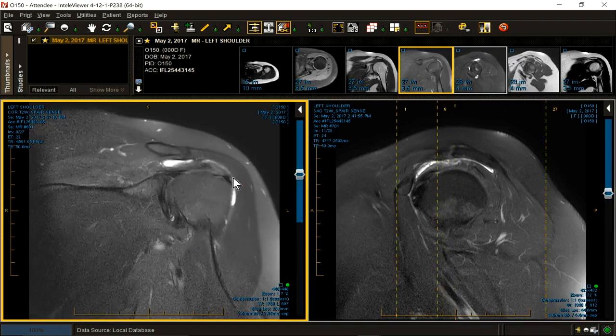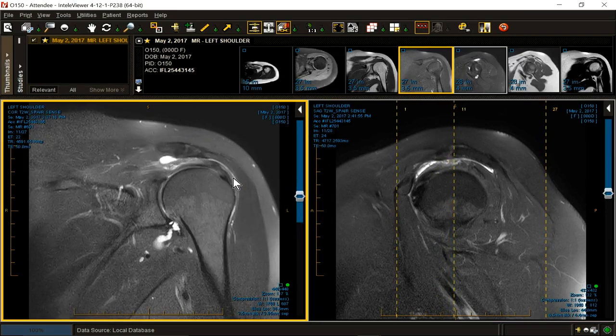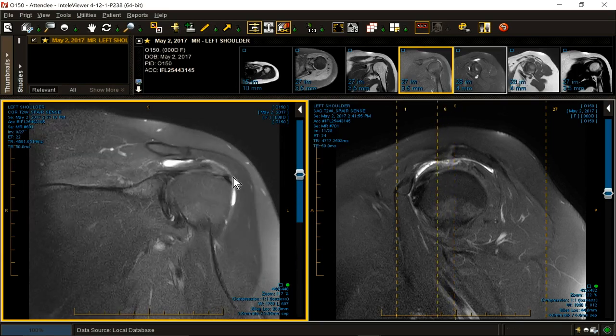We've got some high signal intensity areas, so that draws us right to the area of interest. We were alarmed by the marked atrophy of the supraspinatus, so something is going on with the supraspinatus. What could give you massive atrophy like that? Well, certainly a brachial neuritis could do it, Parsonage-Turner syndrome, but also just disuse. So let's look at our supraspinatus.